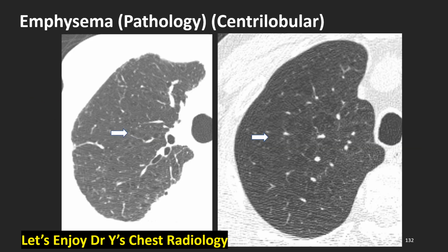Emphysema pathology, centrilobular. Arrows indicate the centrilobular emphysema.